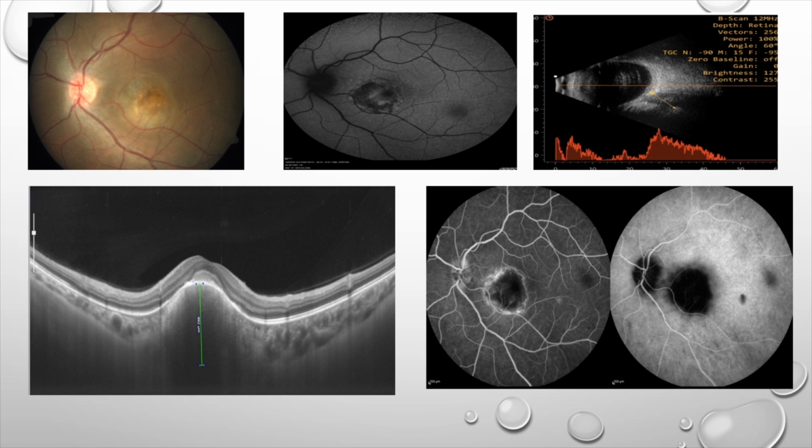In favor of choroidal hemangioma, the physical character of the lesions. The choroidal hemangioma usually presents like this with red, orange hues. That could be a reason. So your diagnosis is on the basis of the color fundus photograph that it is a choroidal hemangioma. Choroidal hemangioma will have high A spikes on ultrasound.